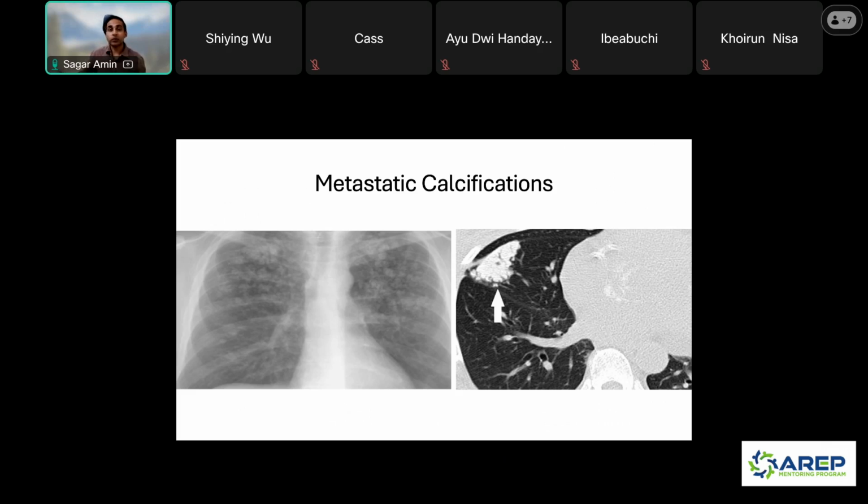And so maybe you might more likely see it in the lower lobes peripherally. And since it's calcification of fibrosis, the lung is abnormal, and I usually will see it as reticulations that are calcified. So dendriform means tree-like, and you can imagine what that could look like, these little branching reticulations that are calcified, as opposed to this, which is more cloud-like calcifications in the upper lobes. So despite the name, this is benign, and it just happens with patients who have end-stage renal disease. So metastatic calcifications.